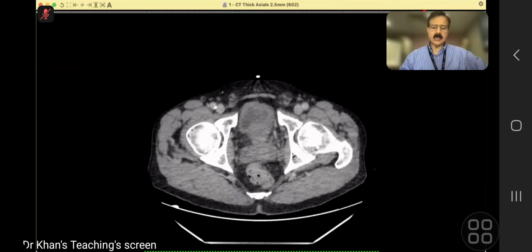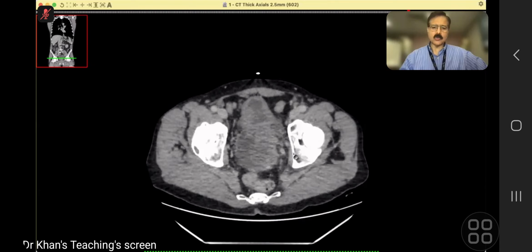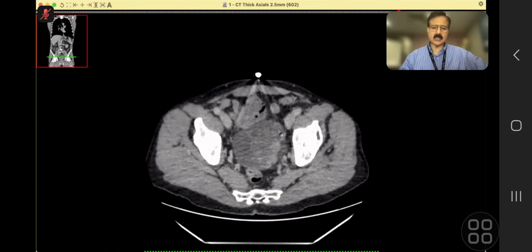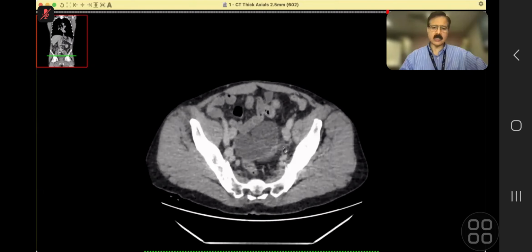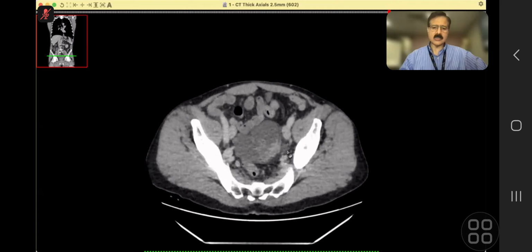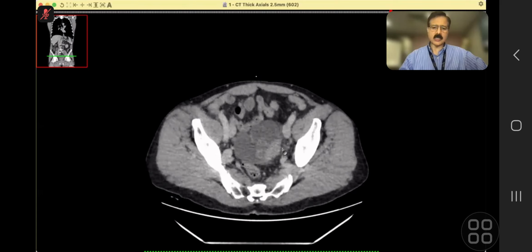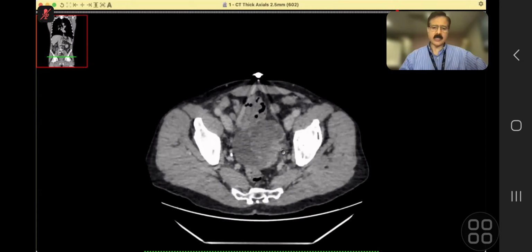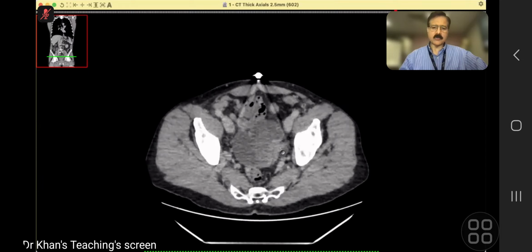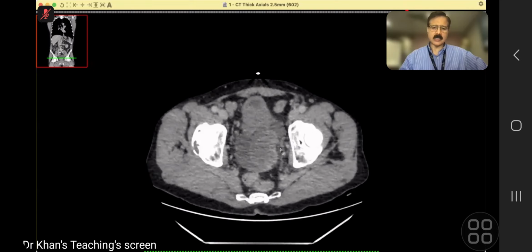On the other hand, if we had to trace the ureter, so this is the dilated ureter where I'm pointing out. This is the ureter, and then it stops here, means that the mass is invading the left ureter, and that is why it is causing it.